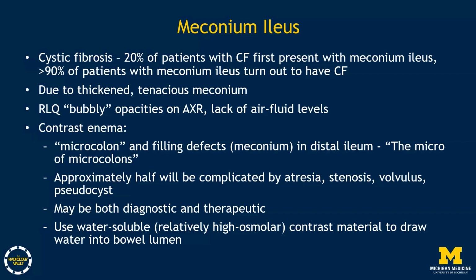Now, we would often use contrast material that is slightly hyperosmolar, but radiodense, so that we can perform the diagnostic study first. It will start the therapeutic process, and then you can use slightly higher osmolar contrast agents to subsequently perform the therapeutic enemas. Today we're only talking about the diagnostic studies, but there are therapeutic options in patients with meconium ileus using the contrast enema.